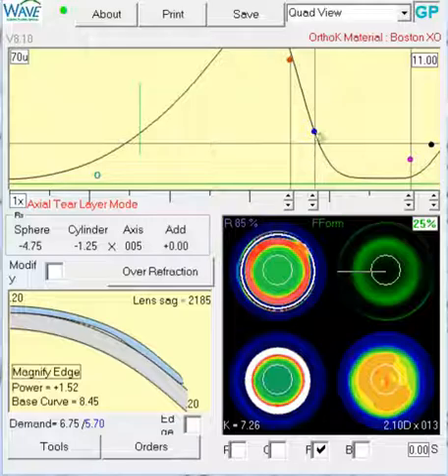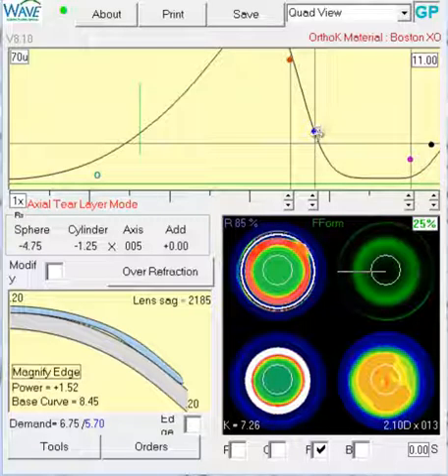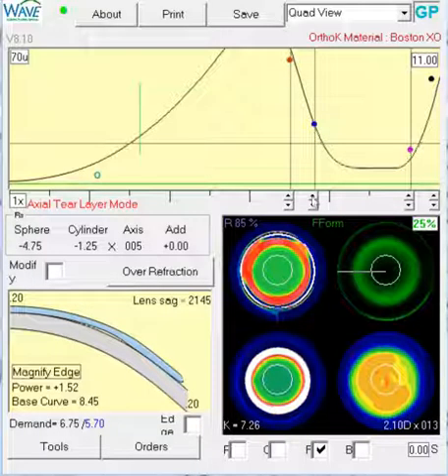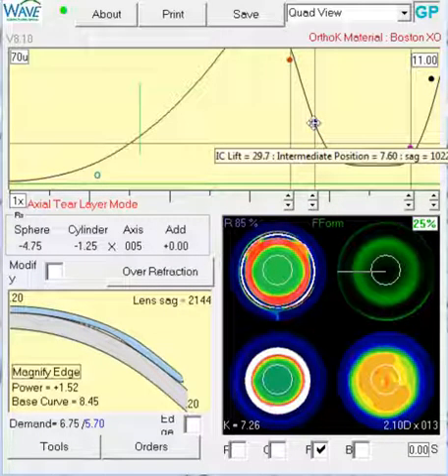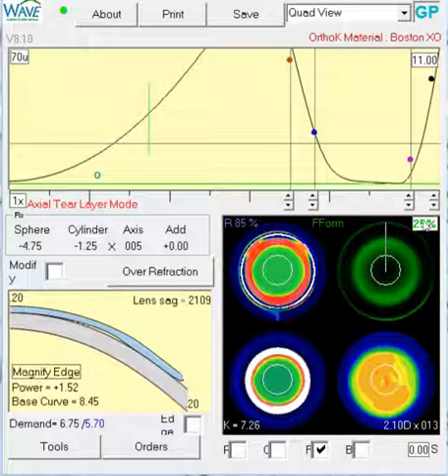We do the same thing on this side. 1029, so we'll be at 1022. Okay, so we have a reduction of 7 there. We're going to have an increase of 8 in the vertical meridian.